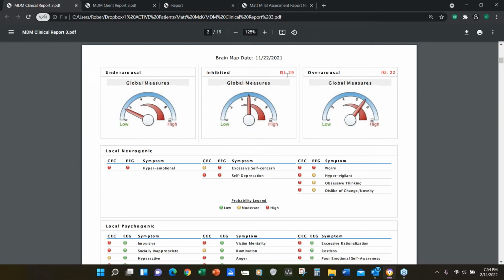In my observation, here we have the ISI scores, and in this case, this was my patient, and I said, so you scored above an 18 on here, which would be clinically significant, and that matches the dial, which says you have some significant depression symptoms. And I'll say the same thing with the ISI 22. I'll say, so you're matching what you told us about your anxiety. So I try to tie those in with the dials when I go over those.